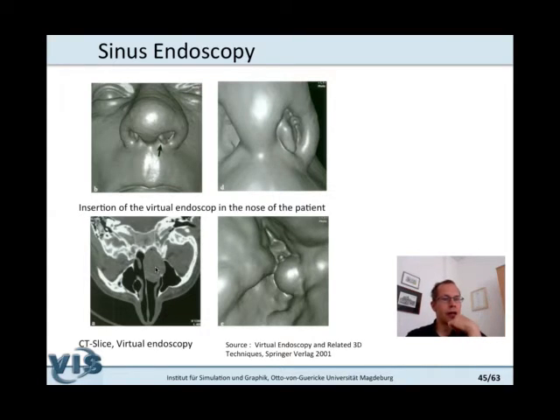And there the skull is thinner, and in some patients it is even abnormally thin. If you come with your instruments very close to such a thin area of the skull base, you may hurt it, and your instruments move inside the brain, which they definitely should not do, and which definitely will cause problems.